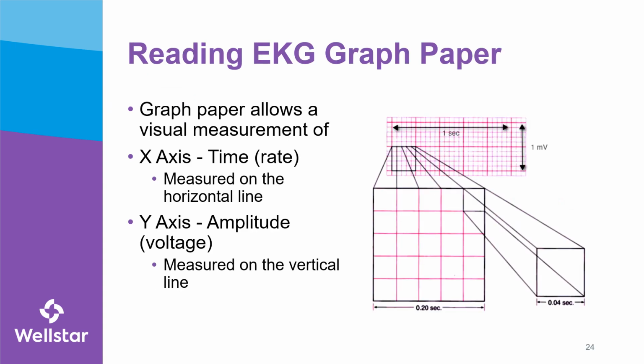As we remember, our x-axis is going to be a representation of time, while our y-axis, or vertical up and down, is going to be a representation of voltage or electricity, called the amplitude of that waveform.